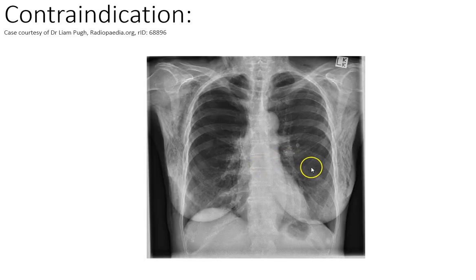So this film's really interesting. I mean, this is quite an overexposed film. You can see all that detail and the lipping and everything. So you can see it's a really black film. That's not why it's in. I've picked it because this is an example of subcutaneous emphysema.